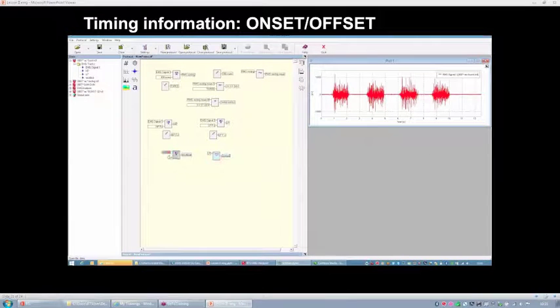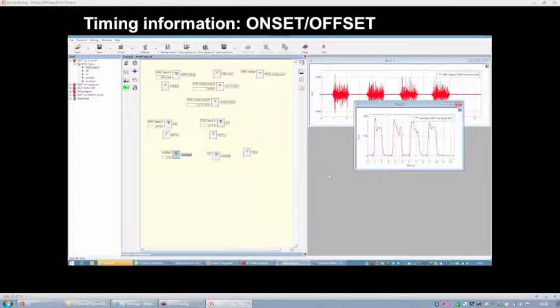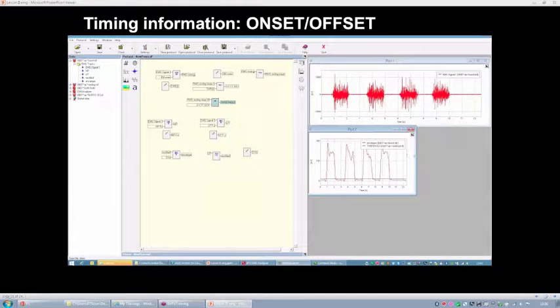Remember that prior to computing the envelope, we have to rectify the track. And now we are going to define the envelope frequency, so 3 Hz, and this is the result. Okay, so now we are going to compare this activity with the threshold we have defined from the resting.